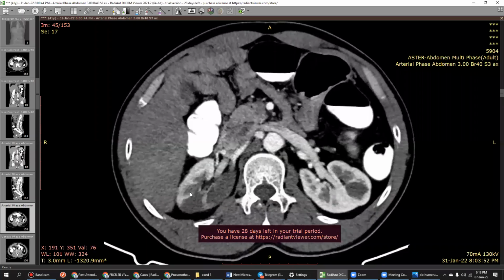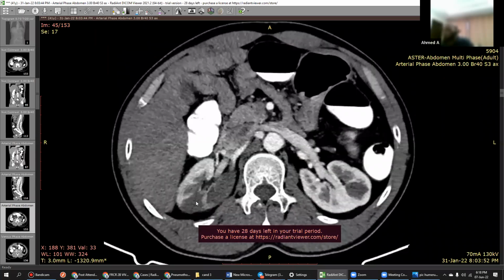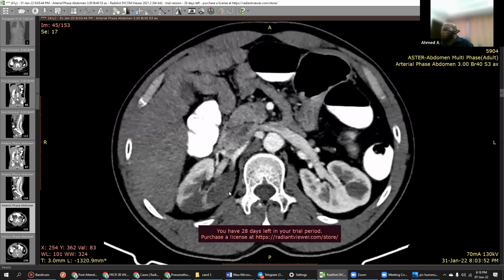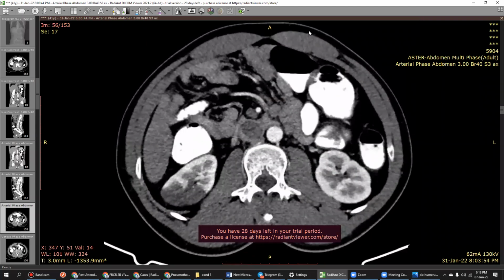It will occur more as a wedge. Renal pyelonephritis is also wedge shaped, don't worry about that. Both of them are wedge shaped. The only thing is the phase, because this is not the nephrogram phase. This is the arteriogram and partly nephrogram. And the other thing is the capsular rim, what you have told, and the clinical features. That's how you differentiate for the discussion purpose.